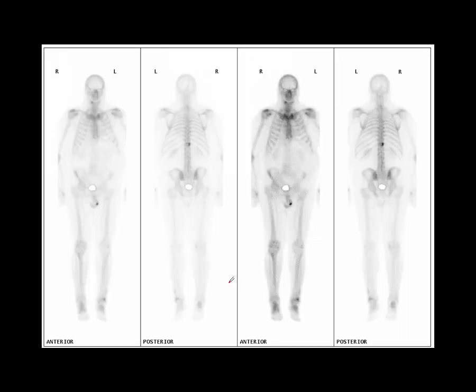Now I'm just going to finish up by talking about chemotherapy response assessment. This is a very, very important aspect of scintigraphy. So here's a patient who had prostate cancer and came with a raised PSA, had a bone scintigram which identified a metastasis here, which we also saw in his CT scan.